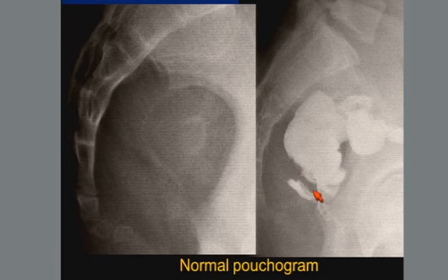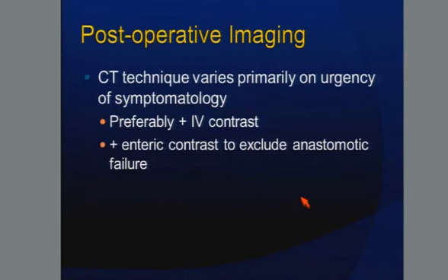When you instill contrast, you get this sort of bizarre looking indentation here, and this was originally called a leak down here. This is in fact just a fold within the patient's pouch. The patient did fine, went on to ileostomy takedown, and has done fine since then.